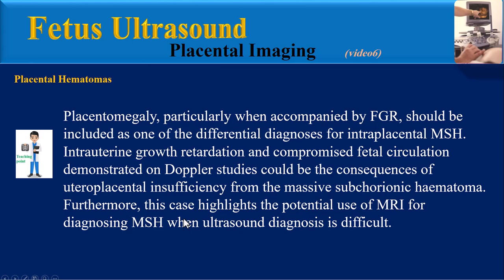Furthermore, this case highlights the potential use of MRI for diagnosis of massive subchorionic hematoma when ultrasound diagnosis is difficult.